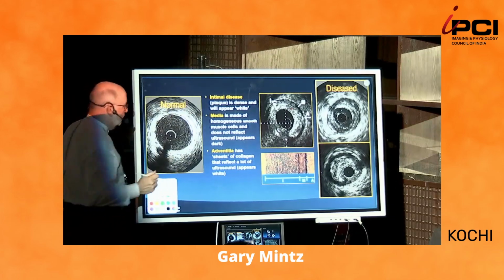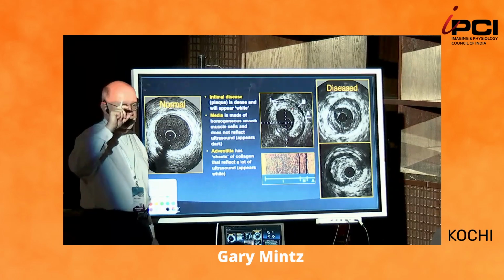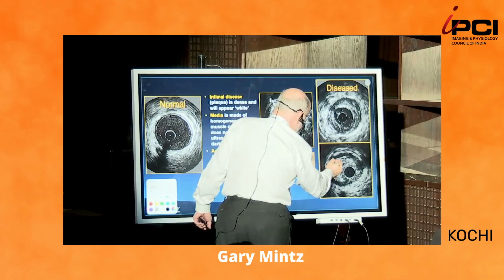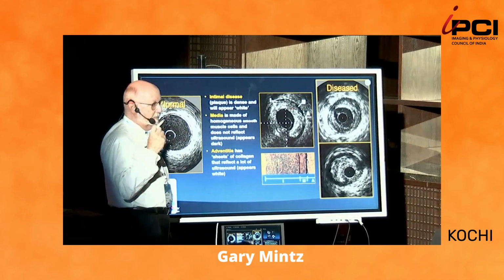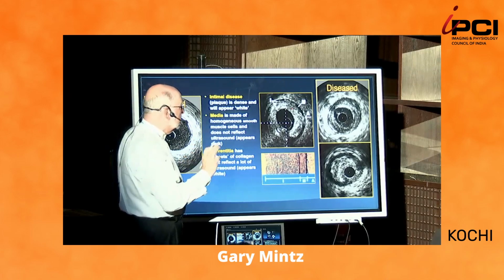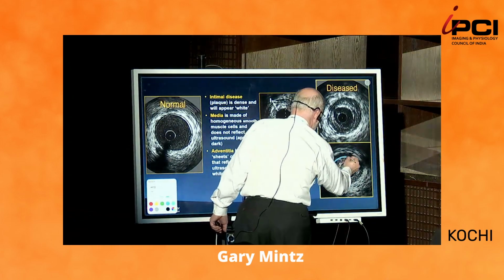The media that you are born with is about 200 microns. With increasing atherosclerosis, the media gets thinner. So if you see an image like this, where you think that this may be media, it is not media. It represents a combination of media plus attenuation of the ultrasound signal going through plaque. That's really important. And the reason that's important is because plaque is not this.